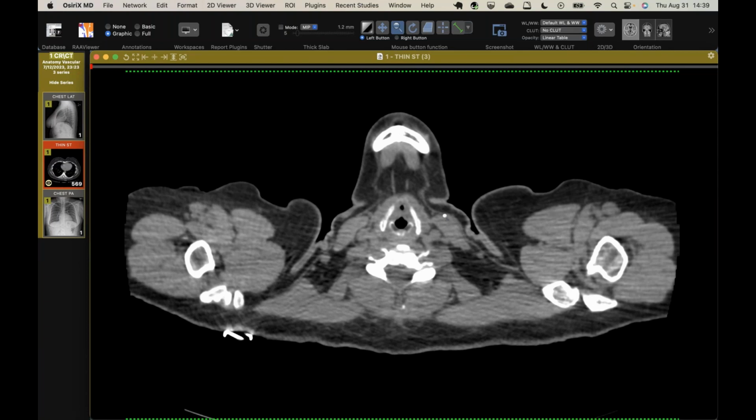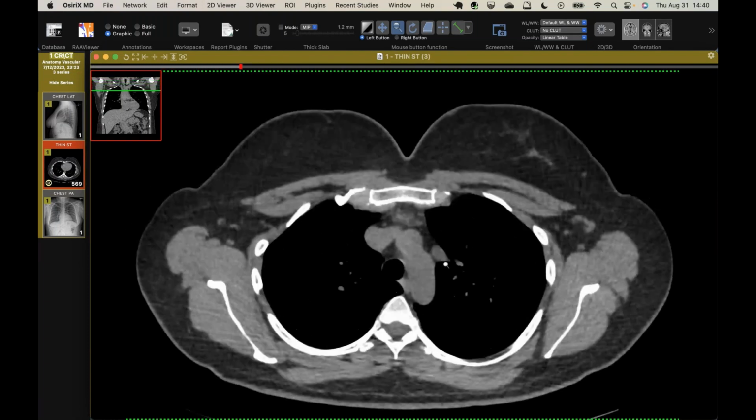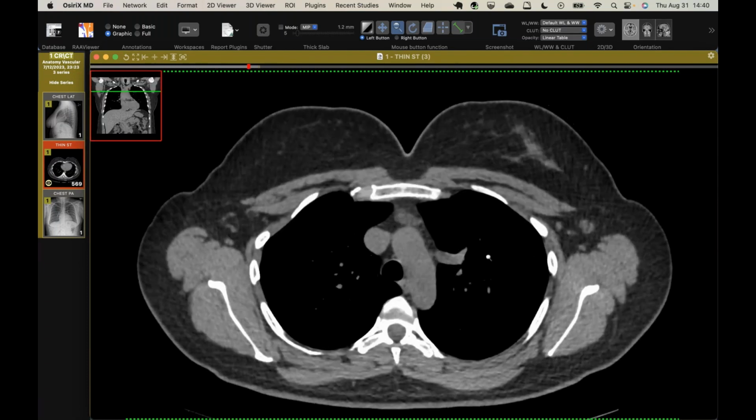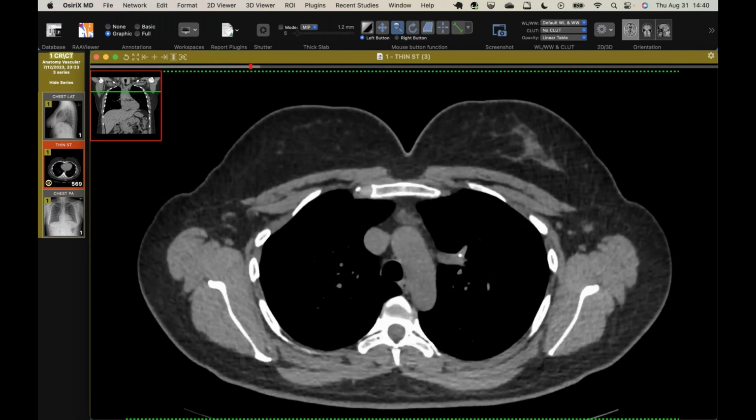Yeah, makes sense. So here's sort of a companion-ish case, which I have a nice radiograph, but to be honest, the finding was more of a retrospective observation. So nothing terribly exciting, except we have nice anomalous drainage of the left upper lobe here into the brachiocephalic vein. But you see this nice big artery.